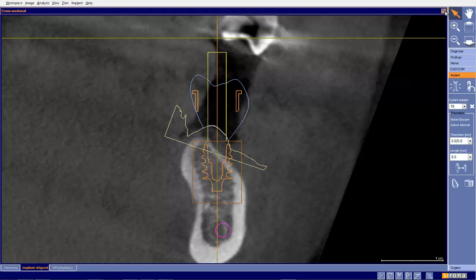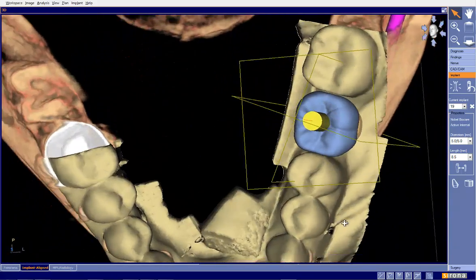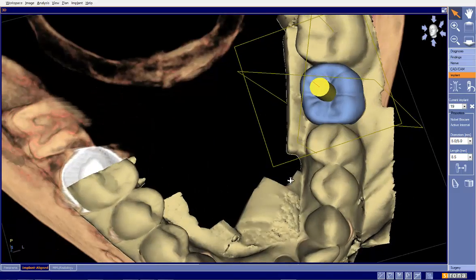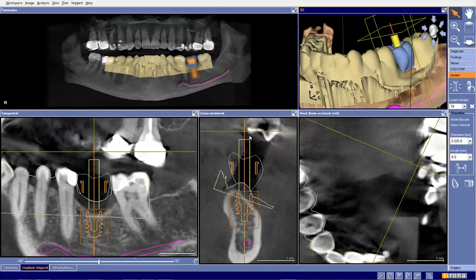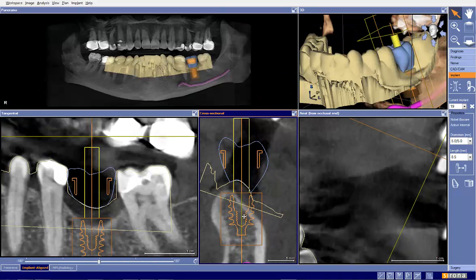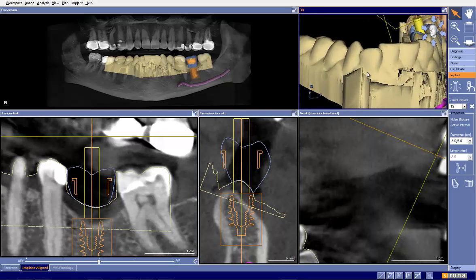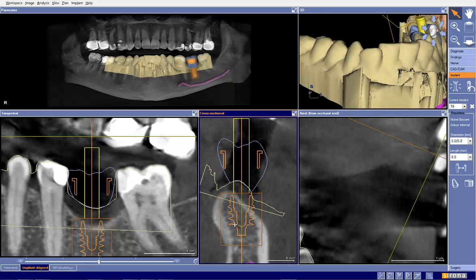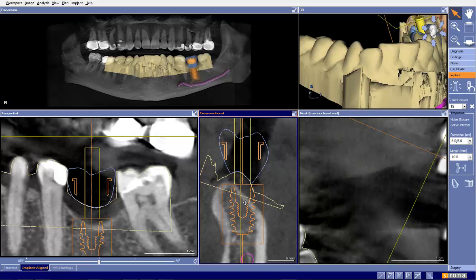Get more ideal positioning. One other thing I want to check on the CEREC plan is that our design itself is actually pretty good. If anything, the design itself is very good. It's just that our margin was drawn way too low. So I would plan this case about like so. The tilt may be off a little bit there. I plan this case about like so right here, then go to something about 10 millimeters long, and maybe tilt it just a bit there.